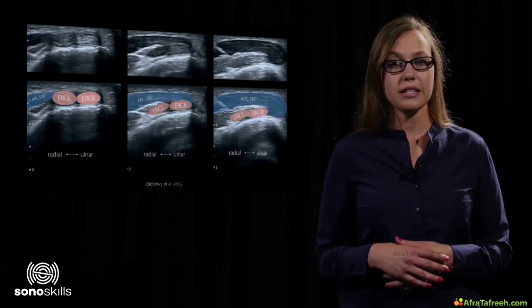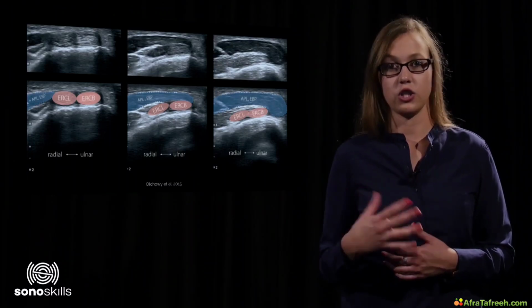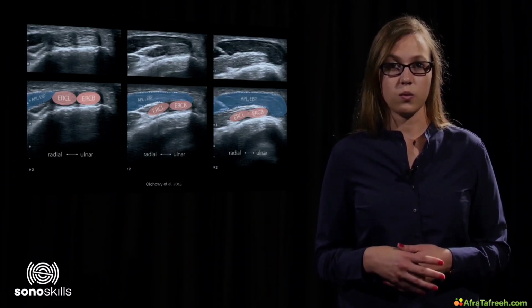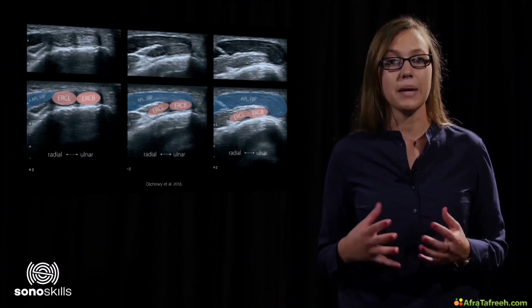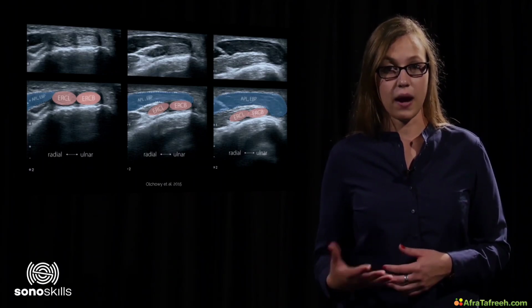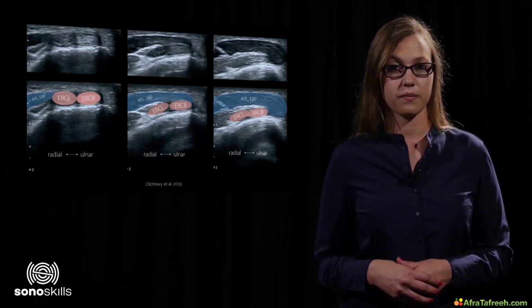The extensor carpi radialis brevis always lies closest to Lister's tubercle. Following the tendons of compartment 2 increasingly proximally, as shown in this image from left to right, the compartment 1 muscles will encroach superficially to the extensor carpi radialis brevis and longus and will become bigger in size. The anatomy, as shown on the right side of this image, is a site of possible pathology.